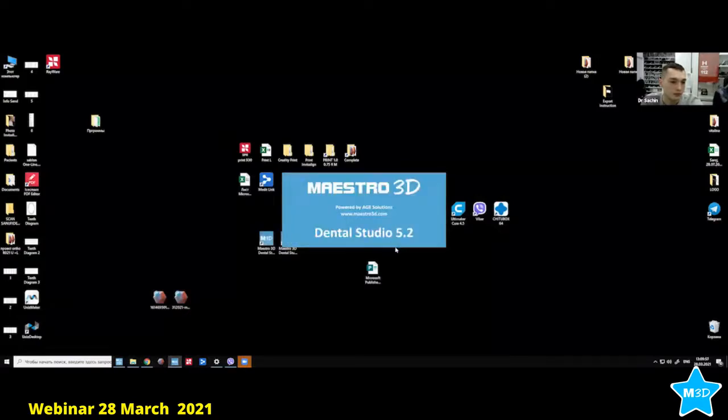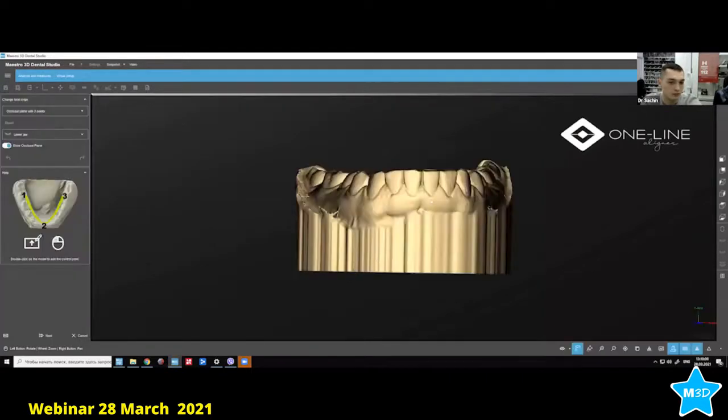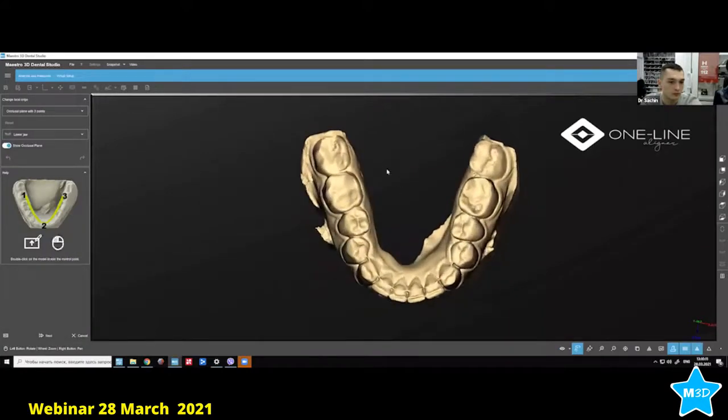So for some cases, we do change the treatment plan midway, and we don't see the changes as planned. And what I will try to do right now is so that you can see. Okay, so here it's a relapse case, maybe.